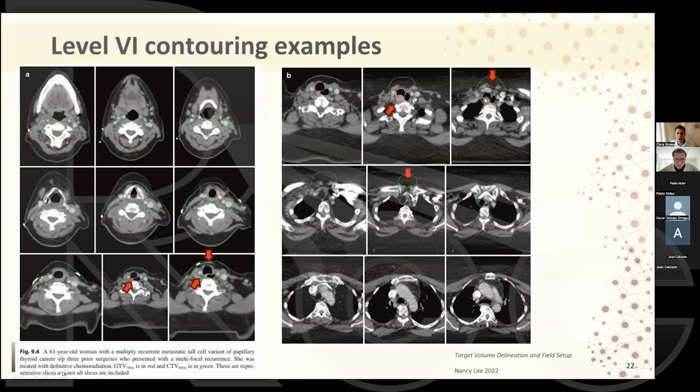This is why we have to cover so far back when we're covering with external beam. You can see this is totally posterior to the trachea, and the other lymph nodes kind of come around to this side. So it's really hard to exclude the esophagus and get adequate coverage.